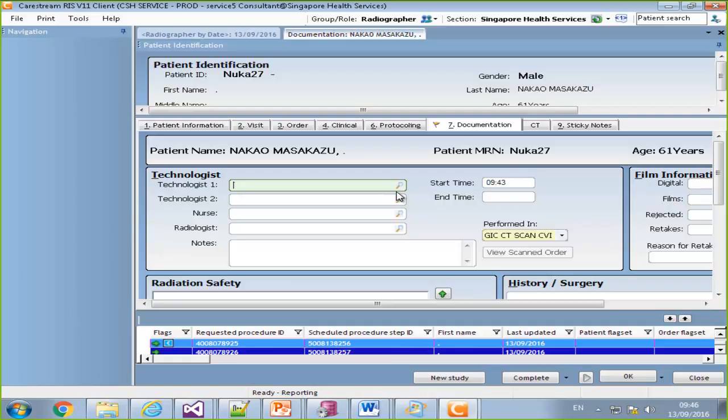The idea is that we are copying all the controls in the documentation except fields or controls that we're explicitly skipping. So the default skip copy for each control will be false, unless we want a certain control to be skip copy. Like for HSO, the NCRT code that's associated with the study.